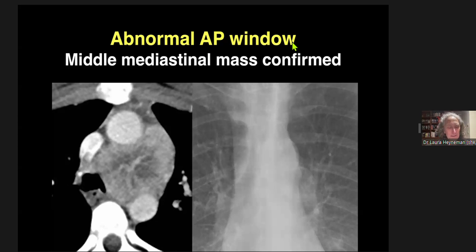If it was a lung mass invading the mediastinum, then the borders with the lung would not be very sharply demarcated, as if it's extraparenchymal pushing against the lung. Rather, the borders with the lung would be ill-defined because it would be involving the lung.